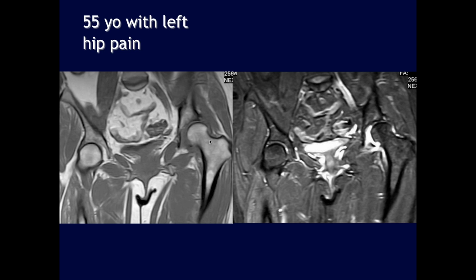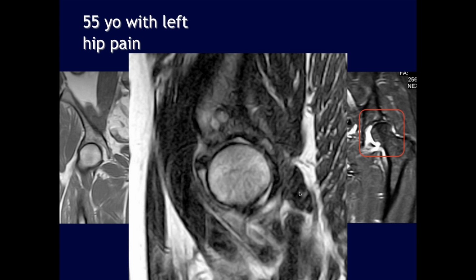I believe so. So 55-year-old with left hip pain. So the left hip, first thing I notice is there's a joint effusion. I'm not sure if it's just positional from the fusion, but it looks like there's kind of under coverage of the femur by the acetabulum. Like the edge of the acetabulum is only around like 50% of the femur, and then you're starting on this like subchondral marrow edema and probably chondral loss compared to the left. So I'm wondering, yeah, now we can see like subchondral cystic change, sclerosis.